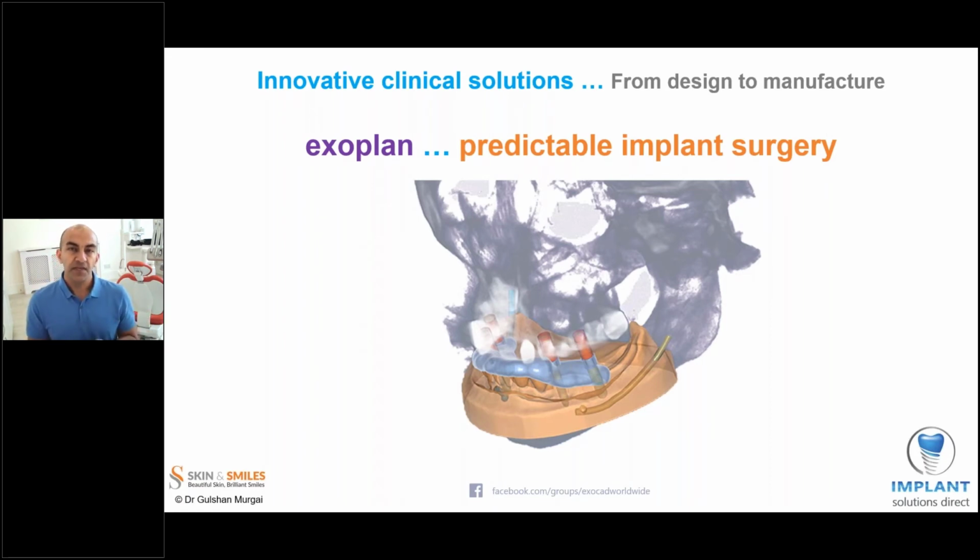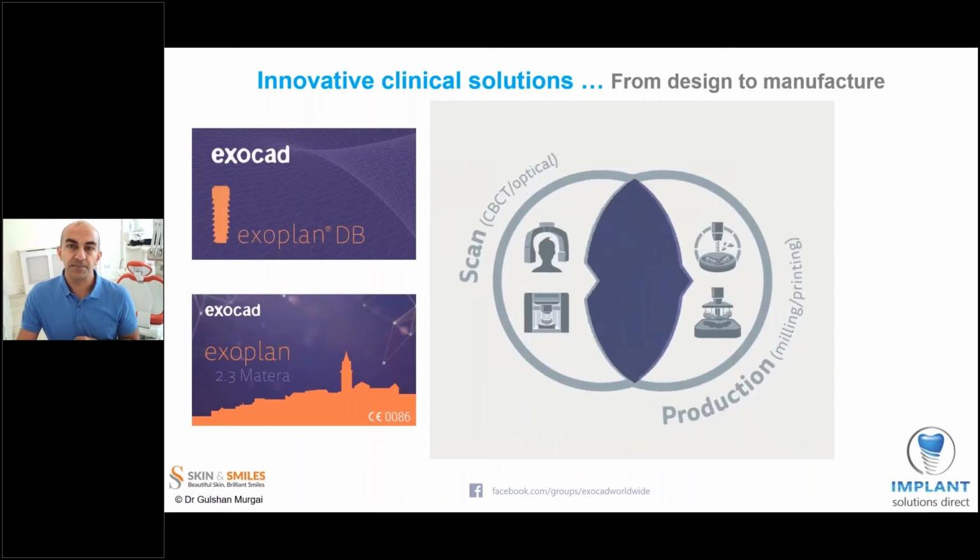Okay, so now we have finished speaking about ChairsideCAD, and I'd like to speak to you about exoplan. Exoplan was released at the Insights meeting in Darmstadt in 2018, and I was very proud to be there and see the launch of this new product. Exoplan is exocad's platform whereby it allows users to not only plan their implant placements, but also then if you have the adequate module, you can then design a 3D printed guide for the surgery. Now, we call this predictable implant surgery, and let me guide you through and show you how we do this.